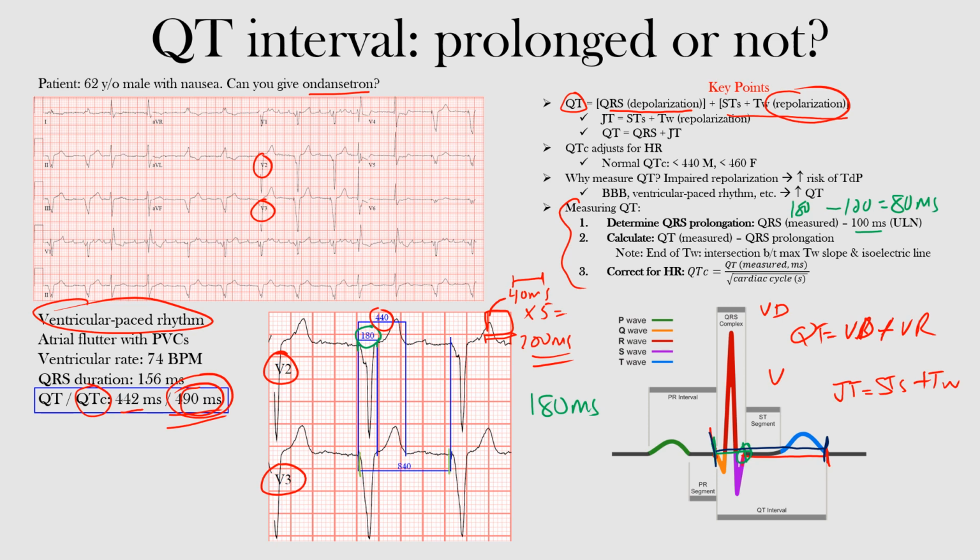So you take that 440 milliseconds and subtract 80 milliseconds, and that gives you 360 milliseconds. Hopefully that makes sense so far.